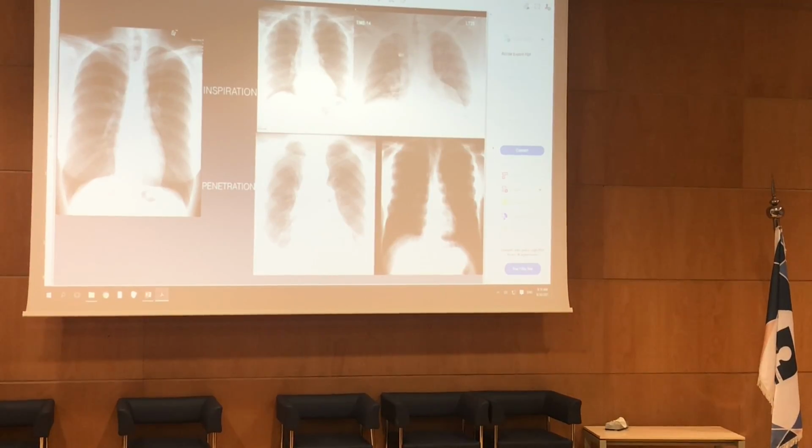No. Or maybe the mediastinum is widened. No, this patient was sitting, inpatient, sitting position, not standing. Can't take a deep breath. So all the artifacts I'm seeing here, and it's also an AP, you will notice the scapula here. So all this contributed to the fact that I'm not seeing everything well and I can call the diagnosis, even though the patient has nothing really. Okay. So that's the importance of inspiration.